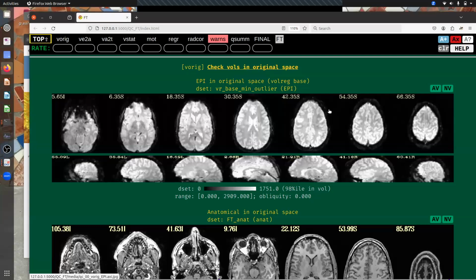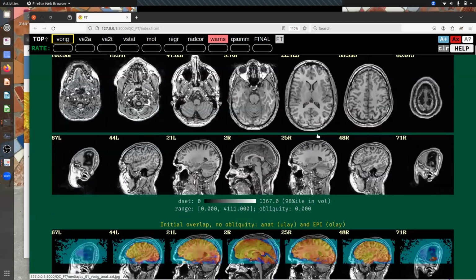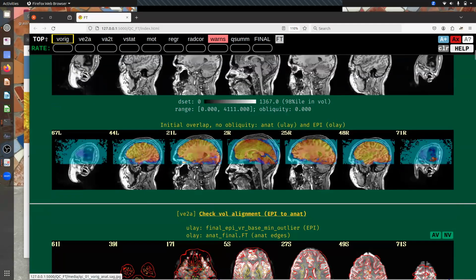Like if we're doing a cerebellum study, and the cerebellum would be right here, going down below, we would be sad. If we're doing even up here, we might be a little sad, because the field of view that we're looking at is probably too tight, because things at the edge are really affected. So anyways, it depends what you want to study. If you're studying the visual cortex and auditory, you're probably okay with this. And you likewise want to make sure that for your anatomical, you can check that they overlap well.